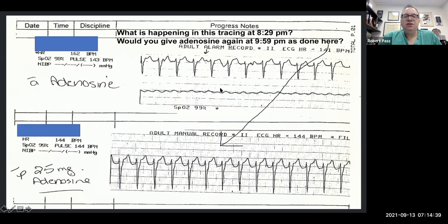And the question I'm asking is, what is happening at this tracing? And would you give adenosine? I see, they were both with adenosine. Would you give adenosine again? So it seems as if at 8:30, they gave adenosine to this rhythm and saw this. And then they repeated it again at about an hour and a half later. So I'm going to ask Chief Fellow, Perna Bonsall, what she thinks about this tracing, and first of all, what's going on here, and then would you have repeated a dose of adenosine here?